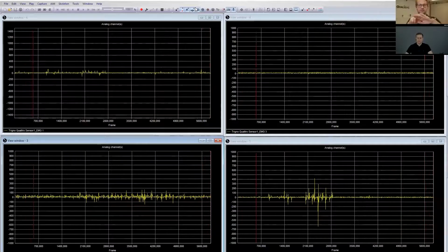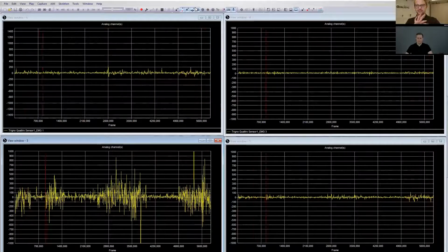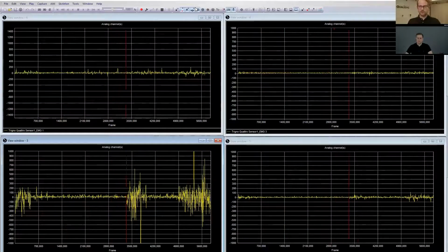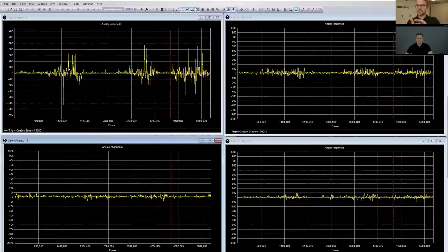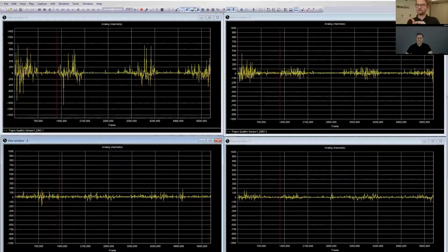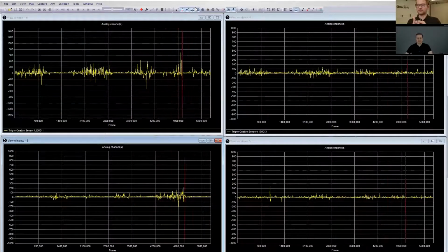So if I apply some resistance on the top of my fingers and push my fingers up, you can see the signal from that sensor. The third one is one of the finger flexors, so that signal seems to be a little weaker. I have to admit that I'm a complete beginner when it comes to palpating finger muscles, so I may not have placed that one perfectly, but we can still see the signal being activated when I'm pressing down or flexing the fingers.